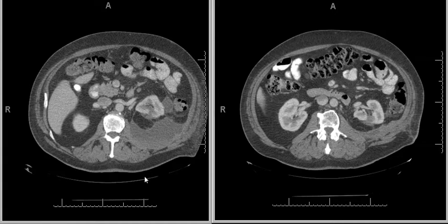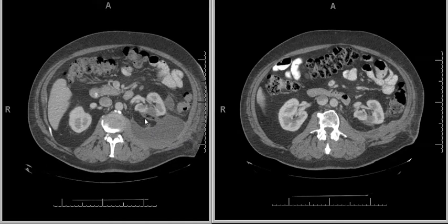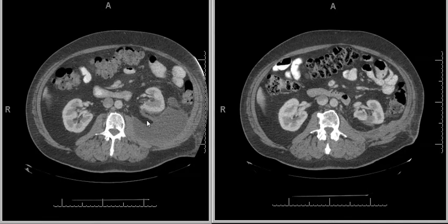This is a 65-year-old male with renal cell carcinoma, status post partial left nephrectomy. The first CT on the left is the 1-month postoperative scan, followed by the 4-month postoperative scan. As you look along the surgical margin, you can see a linear arrangement of air density foci.